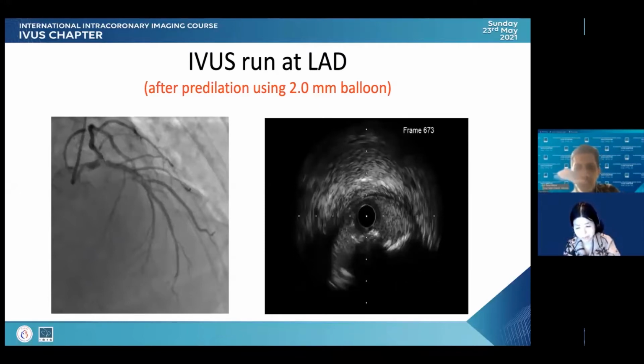That's true, and we think most of the lesion is very soft because of lipidic plaque and thrombus. But we have to remember 5% of the cases are actually very calcified, such as this case, with a calcified nodule causing the MI. So this is really a typical calcified nodule causing the MI.